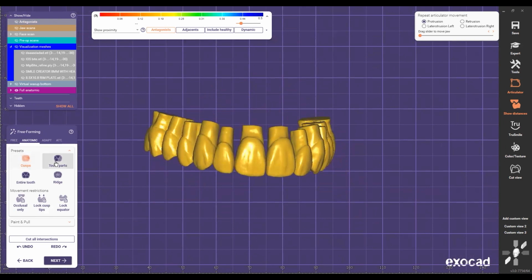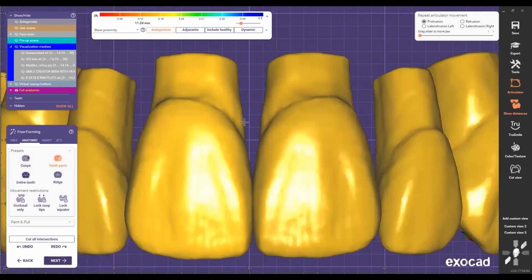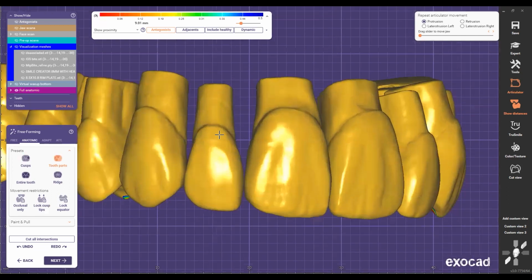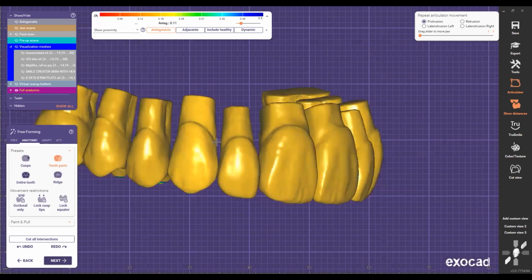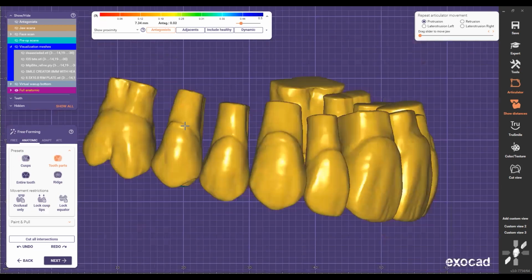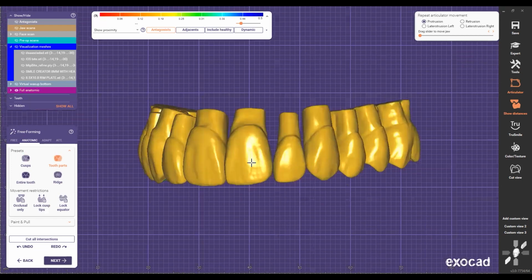What I like to do from here is close these papillas right here, so I don't have a lot of pink showing there. I want to close these areas, so that aesthetically it looks much better than having a lot of pink right there. Okay, that's very important for you guys to know, because we need to make sure that we show more teeth than pink.